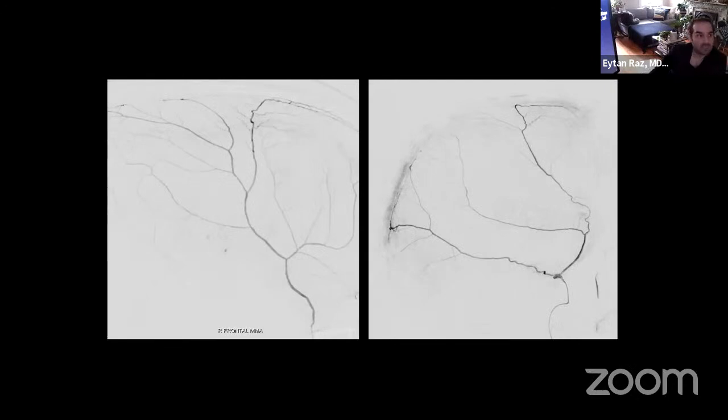Changing gear for the last couple of minutes, to topics in which there's no real clinical role as of yet, but which lead to a better understanding that can eventually lead to clinical roles as well. MMA embolization: with the MMA, you have all sorts of variants. In this case, you have a single dominant frontoparietal branch. In this case, you have a more balanced supply.